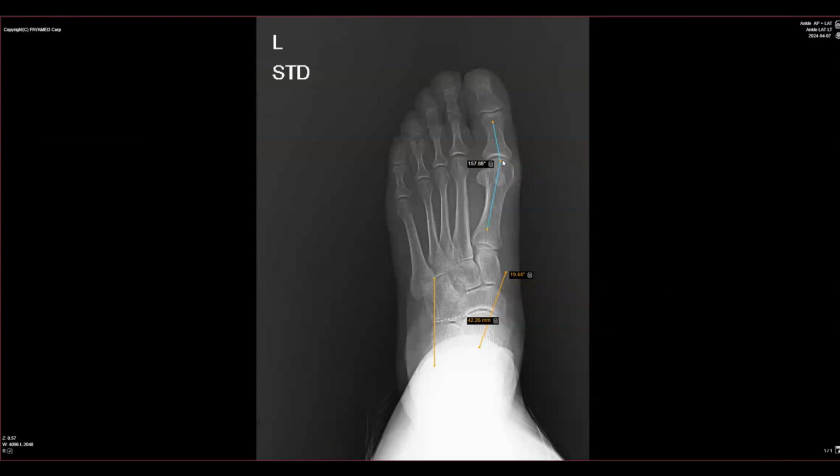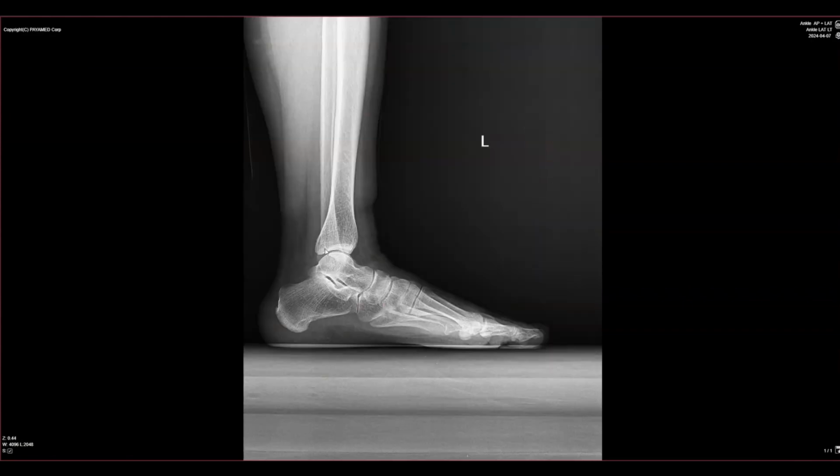And just reposition that. Where about a 9-degree angle is considered normal, 9 to 15 mild, 15 to 25 moderate. And when you see where we are here, we're basically 17 degrees. We're just above mild hallux valgus with that mild sesamoid rotation. So that's a very in-depth look of how we can evaluate x-rays, looking at all sorts of angles, and we see that it's almost normalized here.